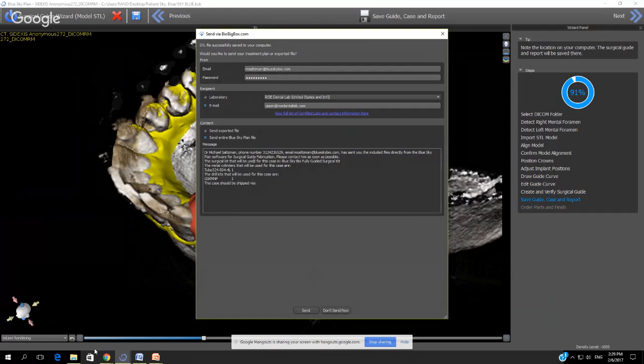You could go ahead and continue using the software while the progress bar is advancing. That's not an issue. And it will send the case to the intended recipient. When it's sent, you get a confirmation that the send happened successfully. When it's downloaded, you get a confirmation that the recipient has downloaded it successfully as well.